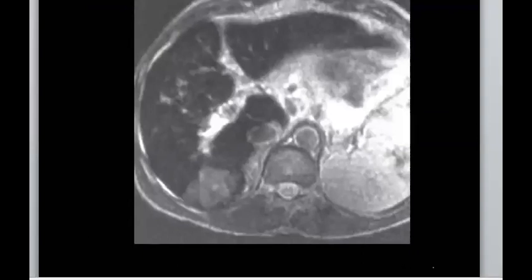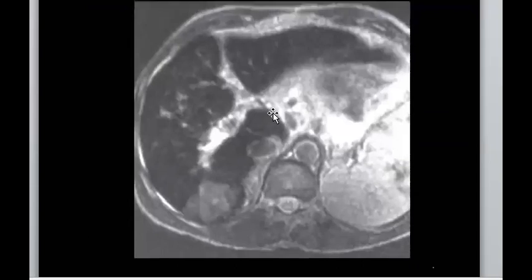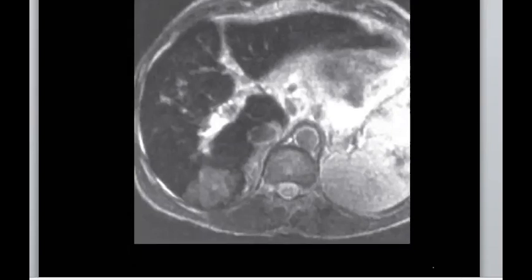When you find this appearance, what do you think? Yeah, you find the low signal of the liver, right? Okay, so it is like the low signal, and if you suggest what you will do, which sequence is very helpful in this case, it will be the T1 out of phase. T1 out of phase, perfect. Nice, and T2 star also, nice. So T1 out of phase.